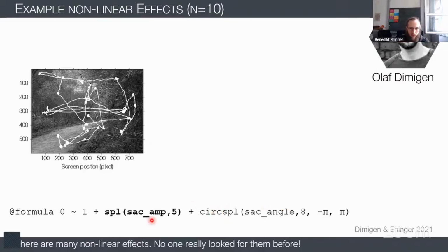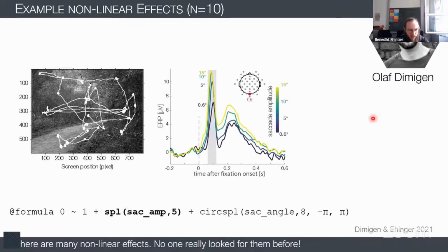So if we do this and we calculate the marginal means, the marginal effects, this is what you already did in the last exercise. This is what we got for channel OZ. And what you can see here is that if we make the distances of where we evaluate the function similar, so this is a step of 5, a step of 5, a step of 4.5, you can see that the distances in the data here are not linear. Here, actually, they are linear, so at around 170 milliseconds this is roughly linear. But here it's clearly nonlinear. And here again, it's clearly nonlinear, but with the reverse pattern.